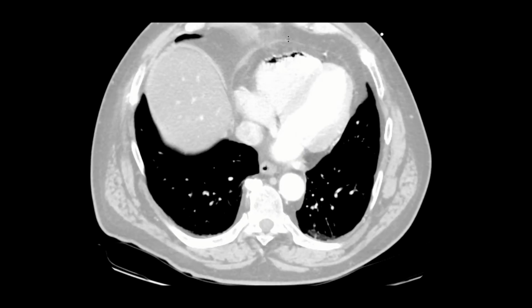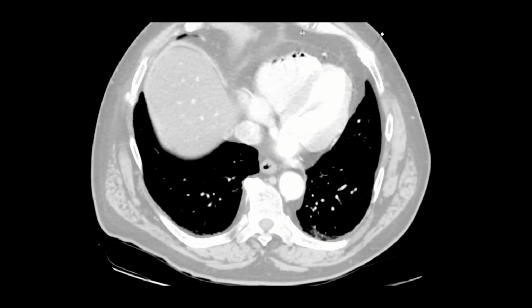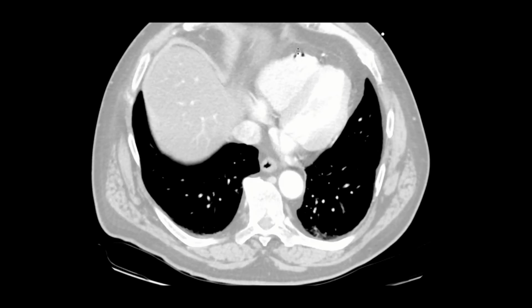This is your dreaded air embolism, which can be caused just by putting in an IV, but putting in an IV, you just get a couple of droplets of air, a couple of little bubbles that don't do anything. There's no clinical significance, so there's nothing to worry about. But in CT, when you have a potential line from the injector all the way to the patient full of air, that can be a problem. If that gets injected into the patient, that can be a problem. So that's the air embolism. I wanted to show you what it was, and then give you the treatment.